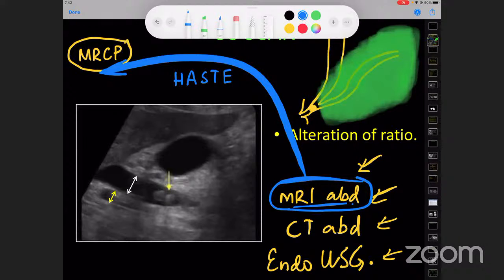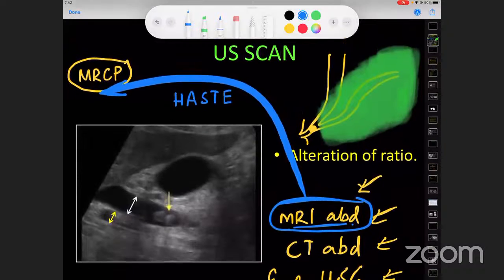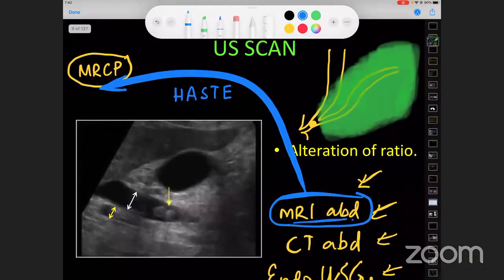But on MRCP, MRI or CT scan, we could see the small peripancreatic collections, which may not be seen on ultrasonography. And to look for a loculated lesser sac collection, or collections along the lateroconal fascia or left anterior pararenal fascia, the MRI scores better than CT scan.